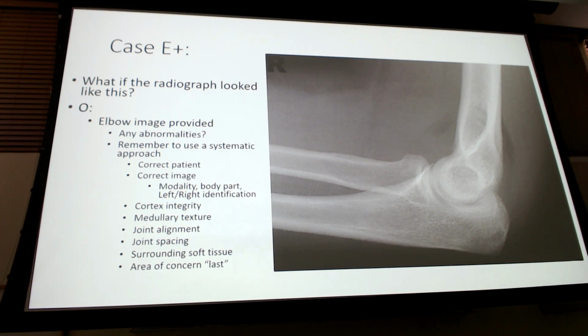Does anybody see the fracture in the elbow? Shy. I sure don't, but I'm always open to learn. So if y'all are showing me stuff sometimes that I don't even see, which is good, right? I mean, it's good. But does everybody see the posterior fat pad sign?